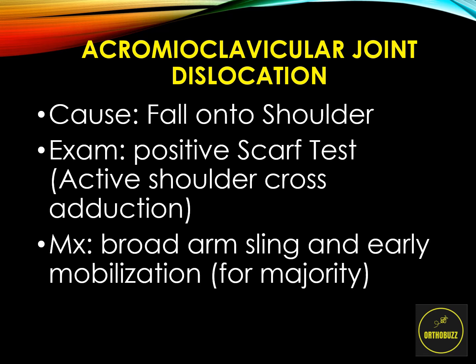As we adduct the shoulder here, it will place more stress on the acromioclavicular joint, which will cause pain. But as we said, we can see the diagnosis clearly on the X-ray, and therefore it would not be advised to put the patient through pain when it's not going to give us any further information.